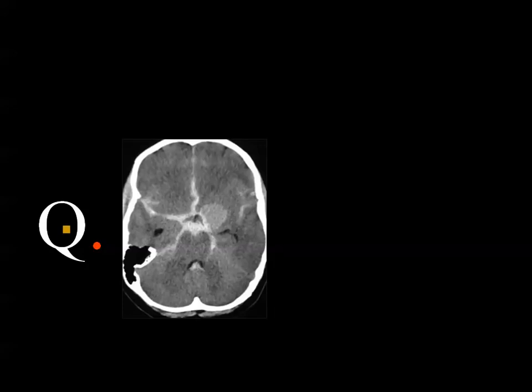Minimal description, please. Please, minimal description. Without contrast. Yeah. Without contrast.